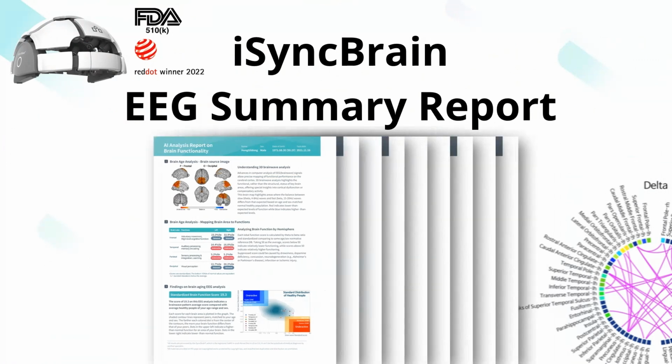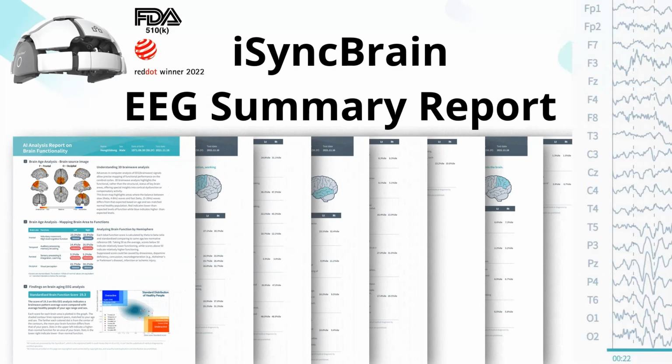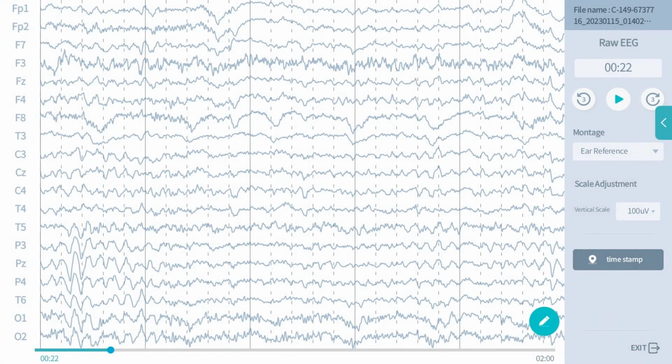This video is for clinicians hoping to use this report in their practice, or for individuals who have received an iSync scan and want to know how to interpret their results. So to start with some background, what is EEG?